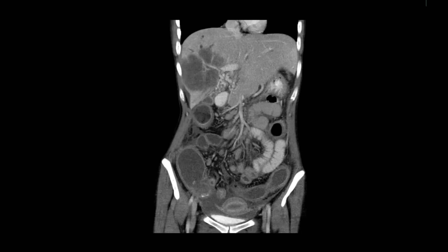Patients with inflammatory bowel disease have a risk for lymphoma. Yes. Less common, what? From the differential, also less likely hepatocellular carcinoma. No. Tuberculoma, abscess formation.